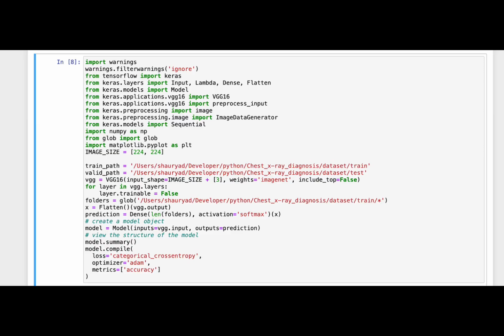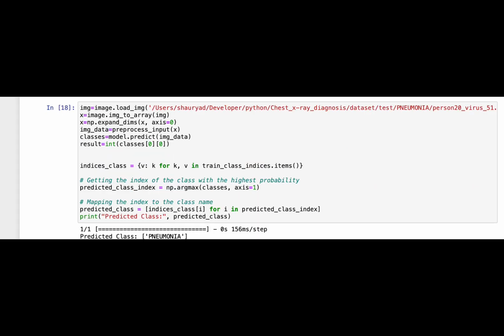This code segment enables the model to categorize X-ray images into different classes, effectively determining the classification for each image. This piece of code acts as the final step for our model and is the output layer in a CNN, and it will finally show the classified output and present the user with what they want.